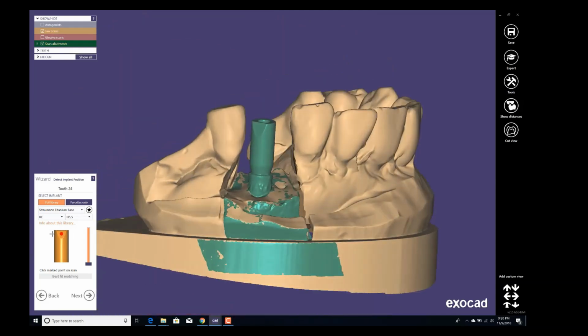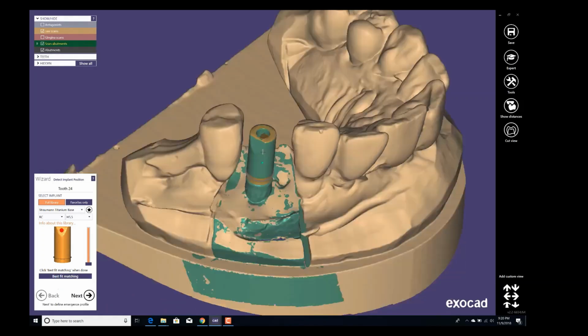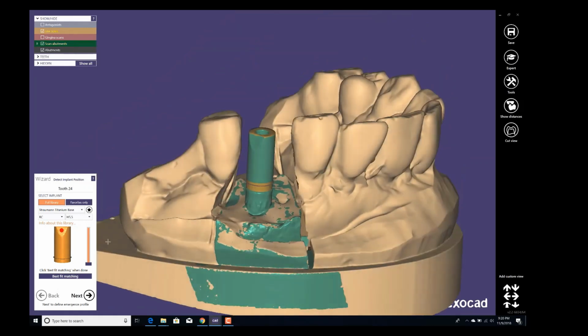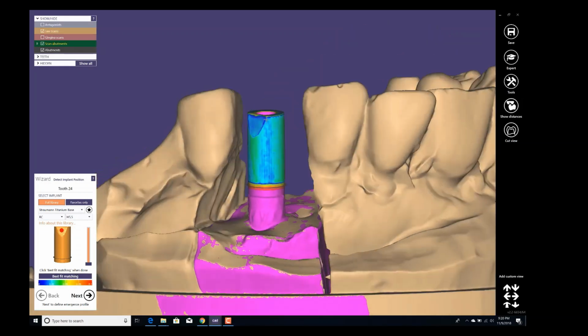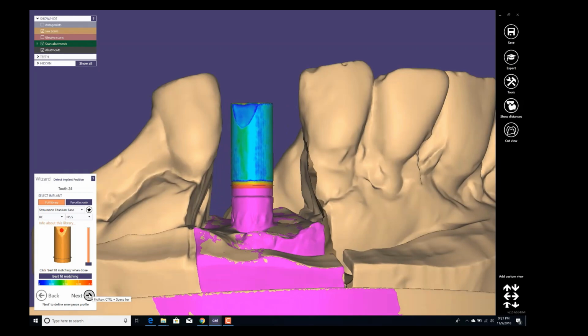As you can see here, I have a scan body inside my ti base, and I have a dot. So what I have to do is click right here on this spot to have a matching of my scan body. Once I do that, I just click best fit matching. To ensure that the matching is okay, by clicking Control and again best fit matching, we can see that the scan body becomes blue, green and blue light. Following this line means that our scan matching is just fine, so we can go ahead with our next step.